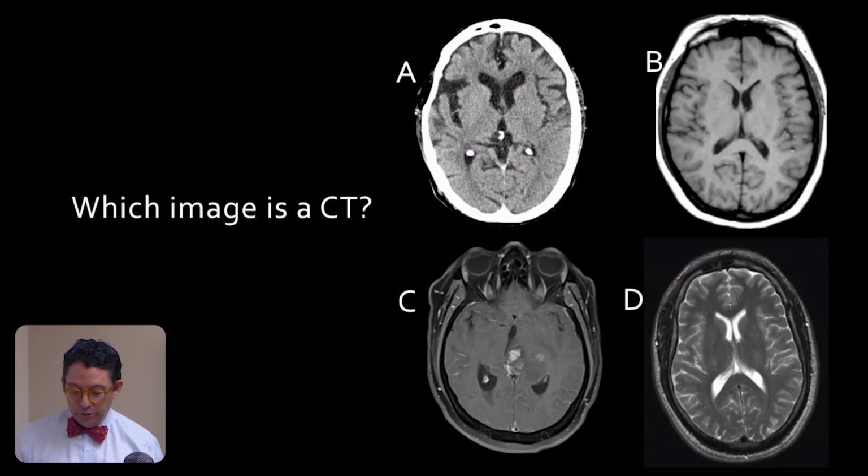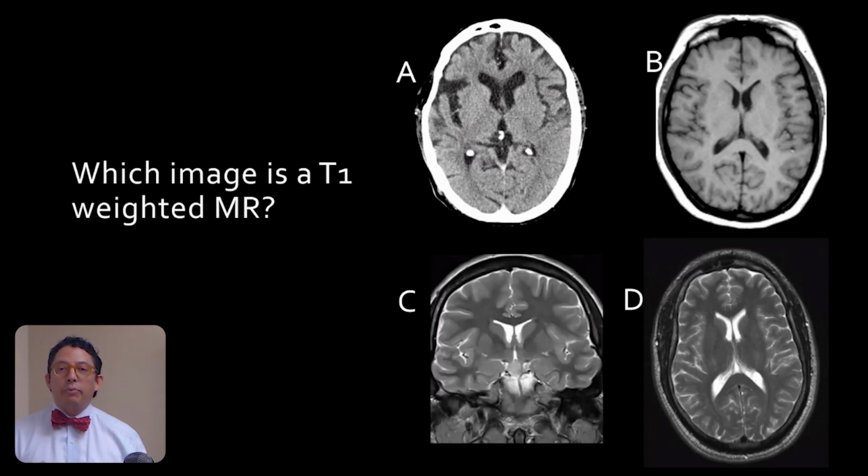Let's answer another question, from the images that you're seeing here, which are basically the same ones we had in the previous question. Which one is a T1 weighted sequence? A, B, C, or D? Well, if we're lucky, at the end of this talk you're going to be able to answer these with your eyes closed. And it's going to give you tools to interpret many wonderful things that you can do through magnetic resonance or with CT.